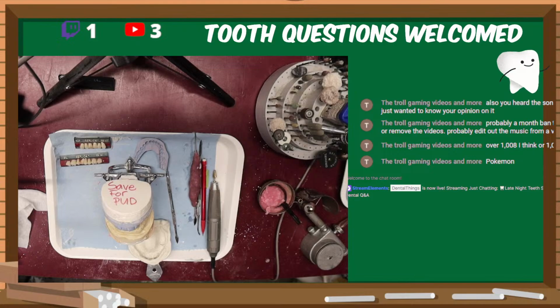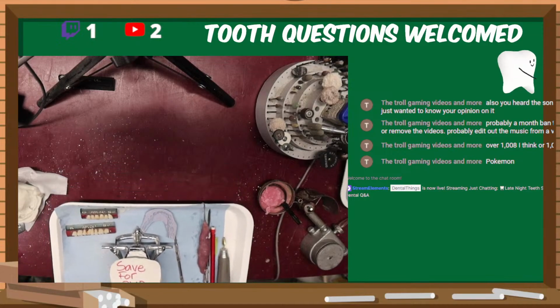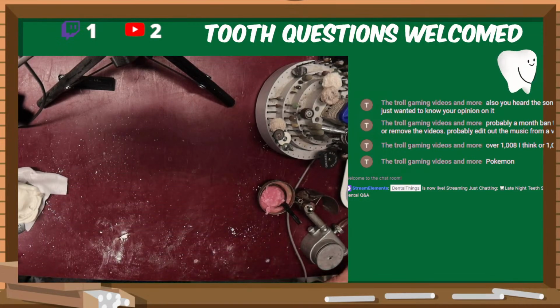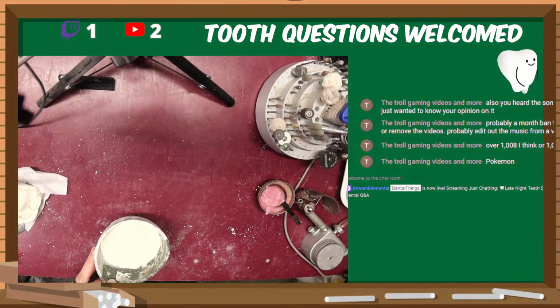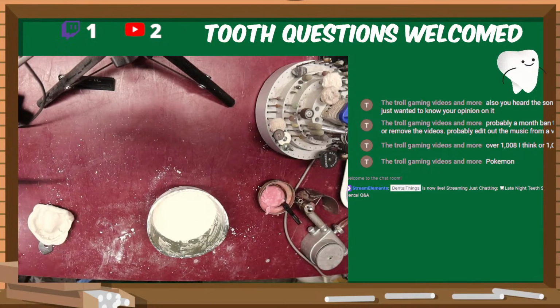Yeah, it's over here. Alright. And I guess so that we can kind of keep it all themed, let's go and pull this off to the side for now, and let's go into pouring up this for a second. I'll leave this over there for now. That too, and I need a spatula.